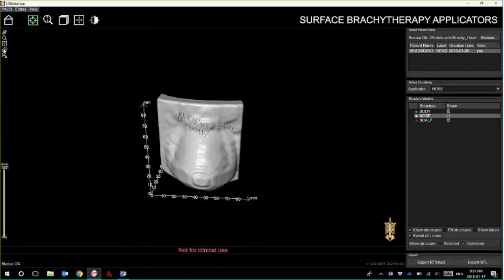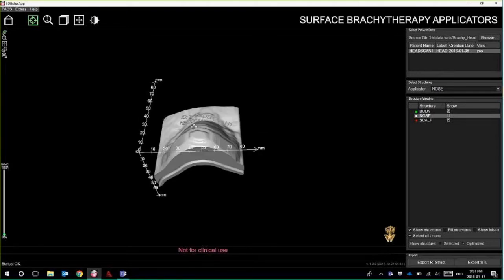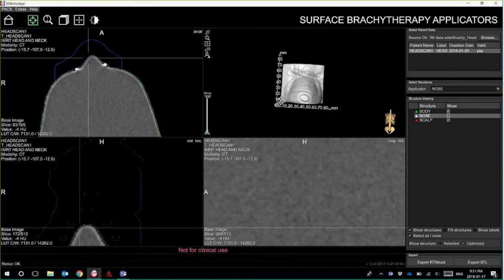And that would be printed right there, so that you never have a patient being treated with a bolus that doesn't quite belong to them. We also provide a cropping plane. Let me demonstrate that very quickly. The cropping plane is used to crop the bottom of the object itself, so that you're getting that nice flat surface that's going to come in contact with your print bed, and you don't have to worry about wobbling very much. You know that's going to have nice sharp edges with a nice flat edge that's going to sit on your print bed. And then from here, it's just a simple export, and this file can be set up to print in a matter of minutes, and you can carry on with your day and have this printing in the background.